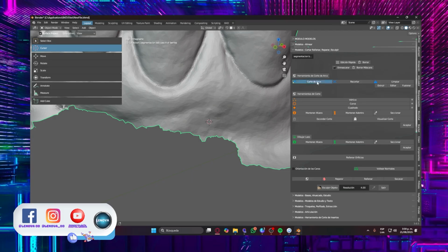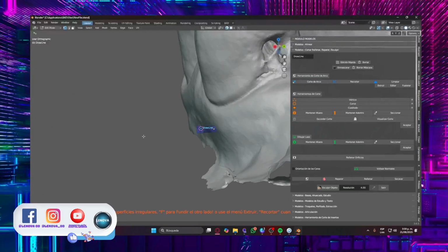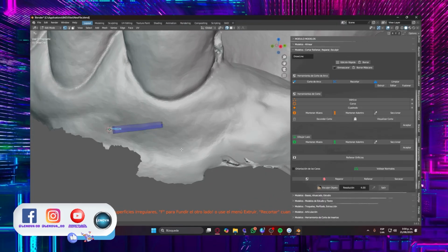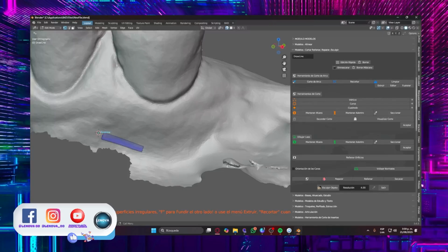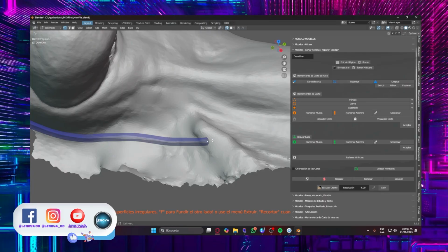This path will come up: 1 node, 2 nodes. I can go through either one. There's no directory telling me it has to be this one. No. So pay attention to this. I select with a left click, press the G key, and move it to the side where I want to continue my cutting path. And I start with the E key. Left click, E, left click. With E, I extrude, left click, fix, E, left click.